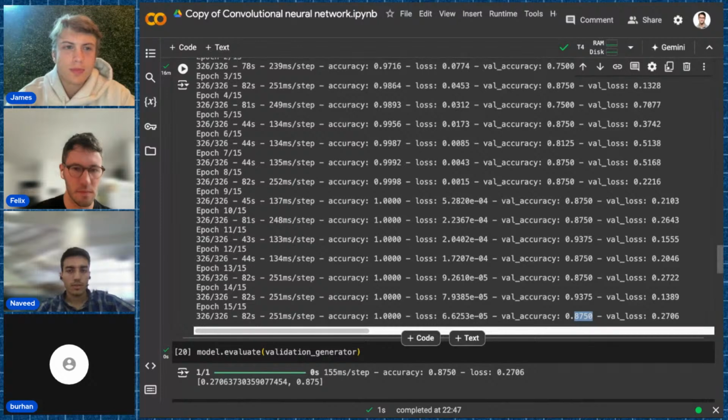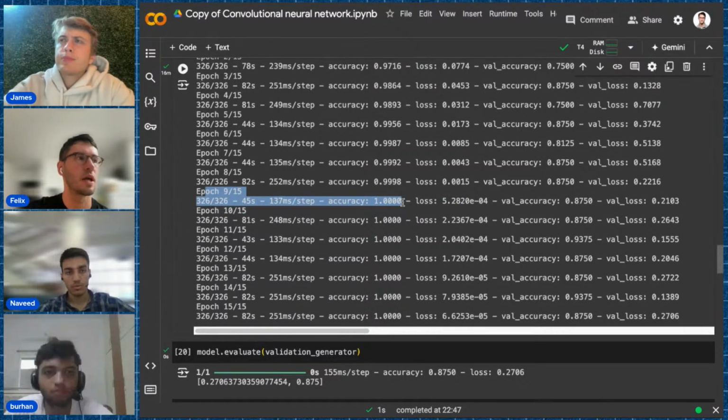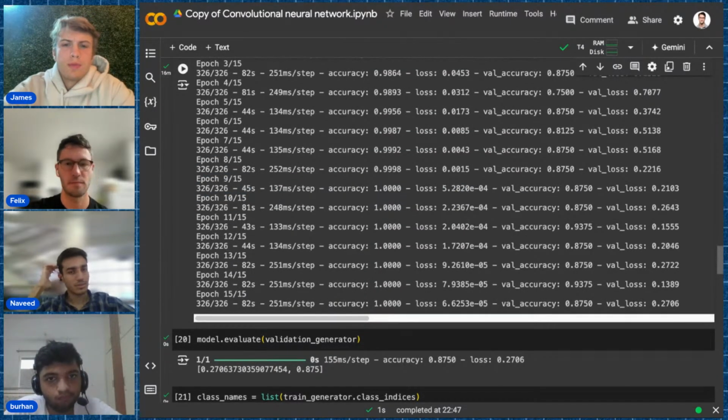Yeah, the test set here is not a very reliable one, so you cannot count too much on that. And this is a typical case of the model getting highly overfitted to the training set because you literally see 100% accuracy on the training set. Maybe this already gives it away, right? If it's 100% after only about half of the training. Can you scroll up to the model again?